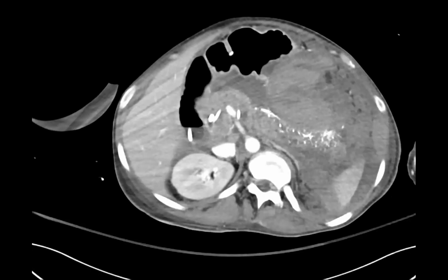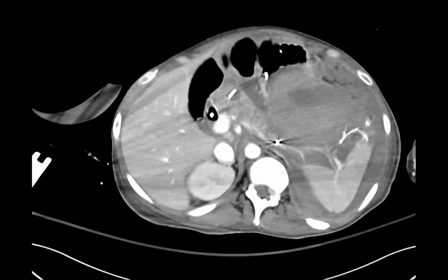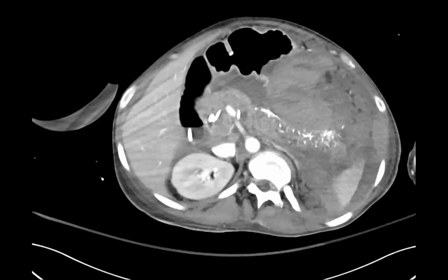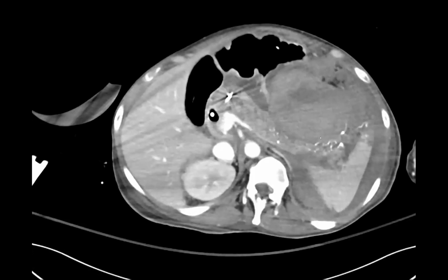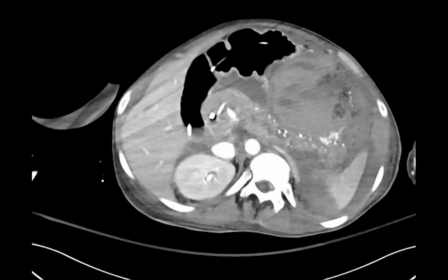But it does look like there is density in a linear structure going into these other linear structures, and even... Did they inject contrast? Yes. So what I didn't know is that they had actually embolized the splenic artery and all of the pancreatic branches because they were bleeding into this hematoma. So if you go back, I'll go back two days.